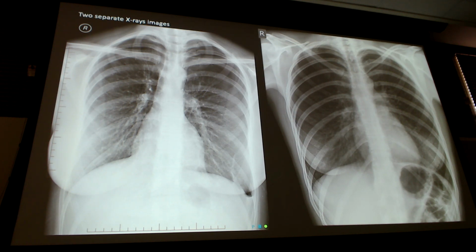No, good. So I like this. You guys are seeing things and you're saying, hey, this looks abnormal. Even though I'm asking you to look for pneumothoraces, you're going through your stepwise process. Call out those things that look funky to you so we can talk about it.